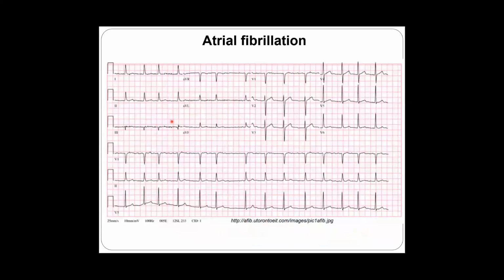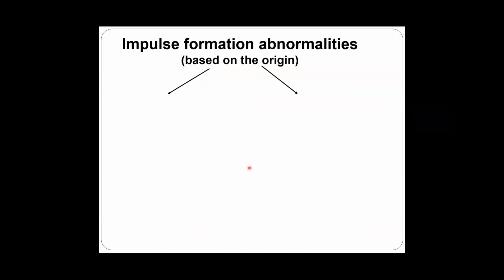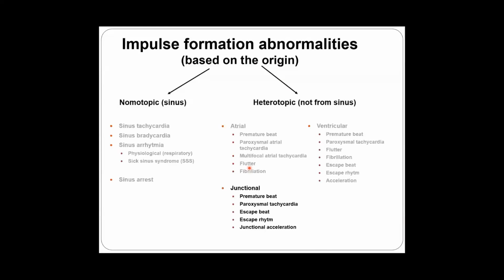This is how atrial fibrillation looks: arrhythmia absoluta and no P wave, or maybe you see some, but the rate is faster than 350. This is what is called atrial fibrillation. We went this far up to this point.